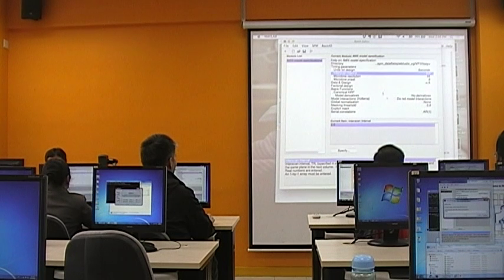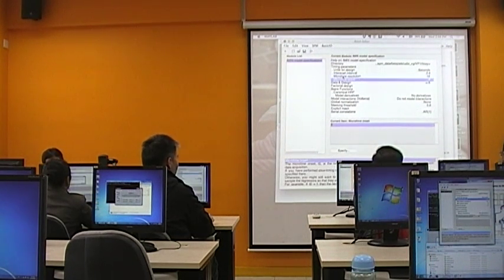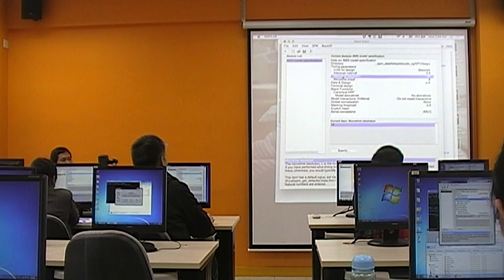Okay. And then you have micro time resolution and micro time onset. That's something you don't need to care about. Generally, if you don't change it, it's okay. Things will work fine, so you don't need to worry too much about it.